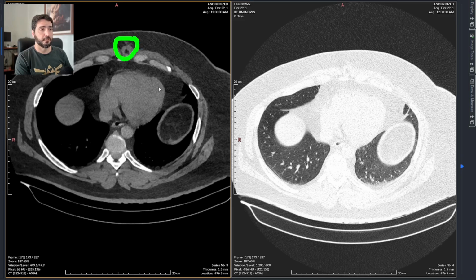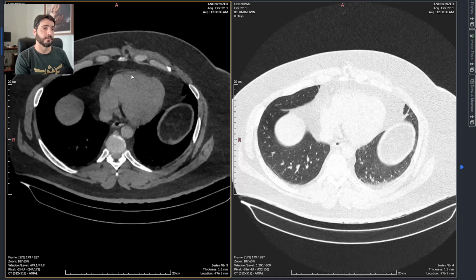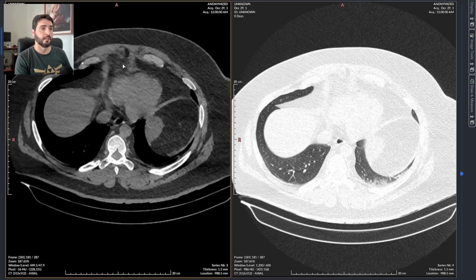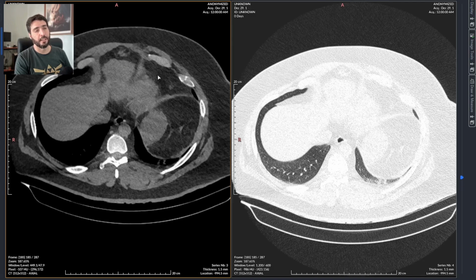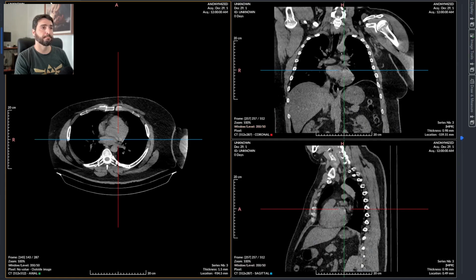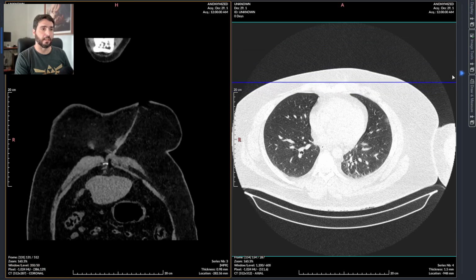This is a lesion, the same stab wound, and it has reached the mediastinum and the abdominal cavity, pretty close to the pericardium right here and right here. So we have a tiny lesion close to the heart and a tiny lesion close to the left lobe of the liver, the hepatic left lobe. So let's do a multiplanar reconstruction. I bet the coronal view may, right there.